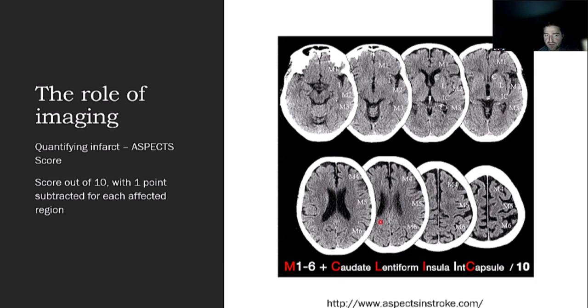I think there's a dedicated talk on perfusion in the half-day schedule. I'll have to double check that. If not, I can circle back on that. Check the motion maps as well, just to make sure that it's not motion related. Other causes can be seizure. Certainly you can get increased perfusion in the affected cerebral hemisphere if you have seizure-related activity.